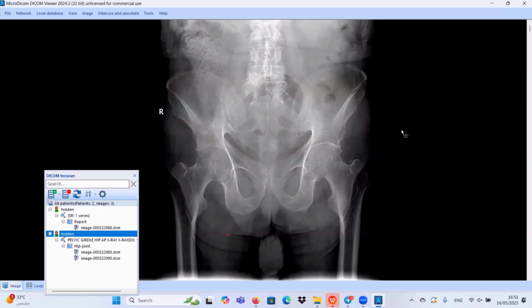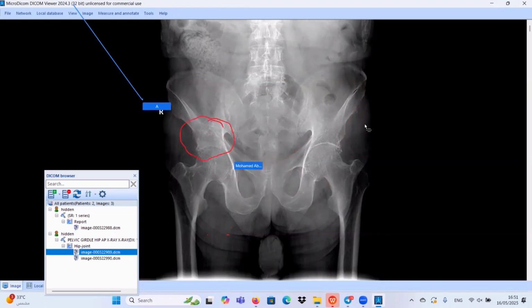So you should check the internal ring, you should check the external ring, and also you should check the obturator rings, the cortex of the obturator rings. Also, you should check this ring along the inferior aspect of the femoral neck. Please put this one in your checklist. The cortex here is disrupted at this area. Okay, let's go to our next case.